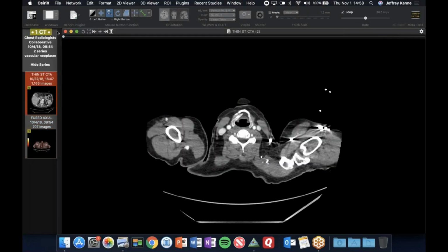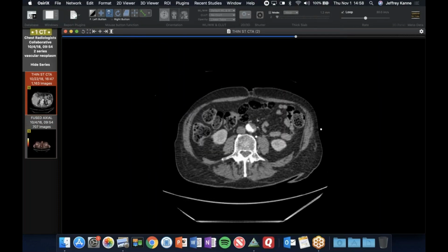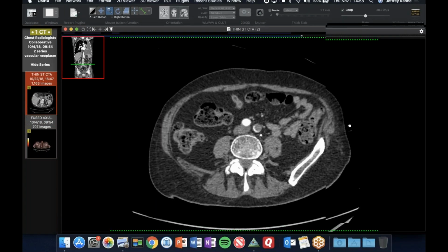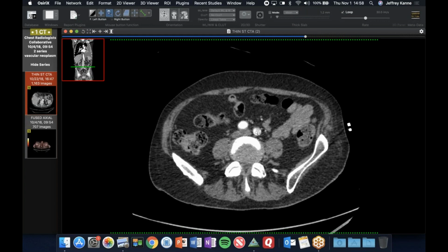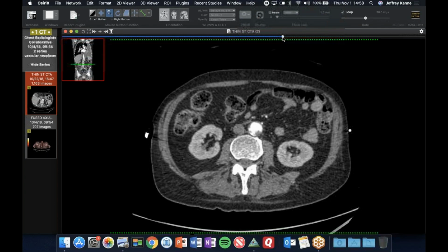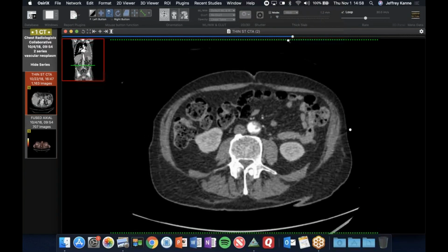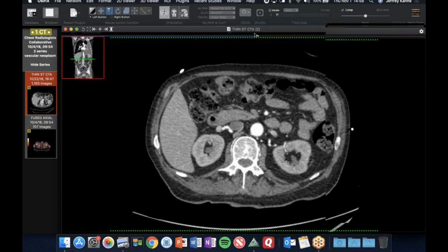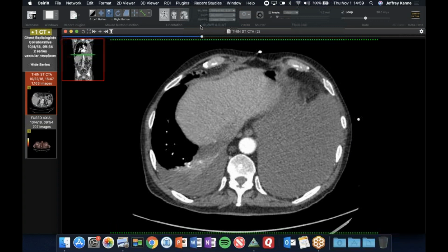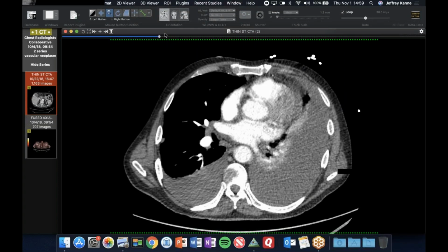And we go back to the CT scan and scroll way down. You can see there's this irregular, ugly soft tissue. It looks almost like plaque, except it's very ratty looking. It fills most of the lumen. That looks more mass-like, and there's no atherosclerosis really to speak of in that area. So I think this frothy looking stuff is all tumor. So this is an iliac artery angiosarcoma that has metastasized to the chest, and I think it's primarily pleural and then some lymph node involvement as well. But just a weird one.